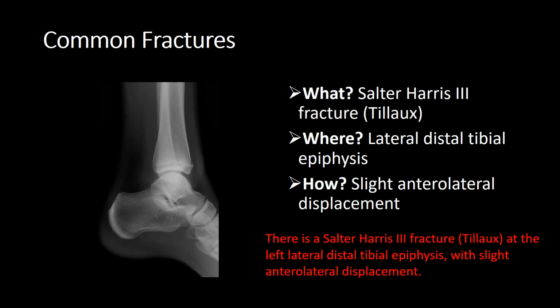So what is it? It's a Salter-Harris 3 fracture, Tillaux, where it's the lateral distal tibial epiphysis. How? Slight anterolateral displacement.